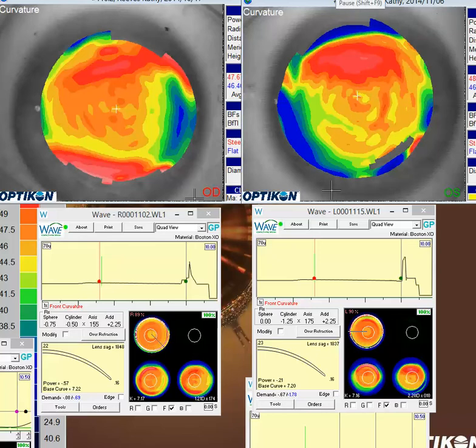I see from your request that you're struggling converting this patient to a multifocal wave lens from a soft lens. Well, if we look at a couple things, we'll first talk about these topographies. As you know, if we look at your topography, we don't have a lot of great data out here, and as you know, sometimes it's hard to capture that data. And we got quite a bit of steepening here in the zone that you were able to capture.